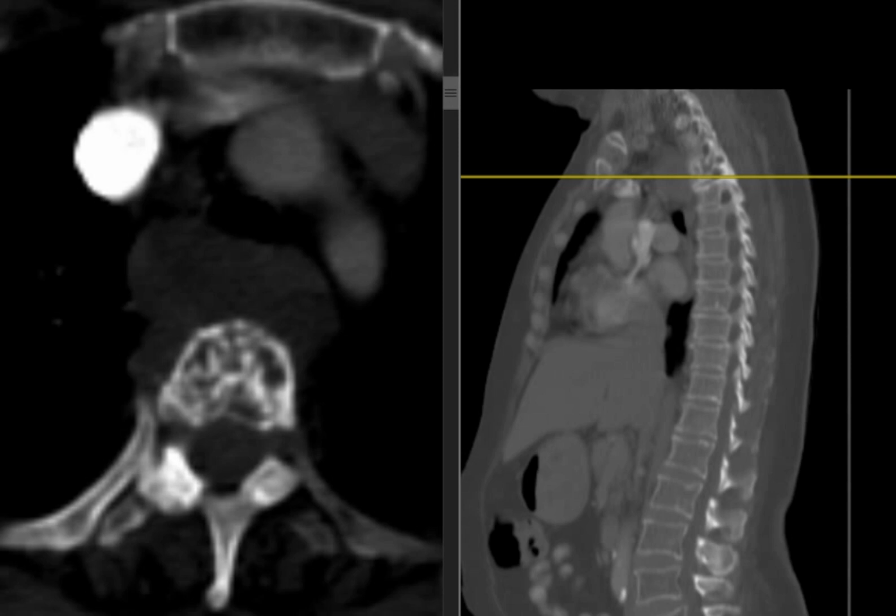Expanding. It's collapsing. It's not expanding. Mini brain sign. Mini brain sign. This is typical mini brain sign. Solitary vertebral involvement. Which, some people say, negates the need for a biopsy. It's so typical. When you see mini brain sign, it's plasmacytoma.